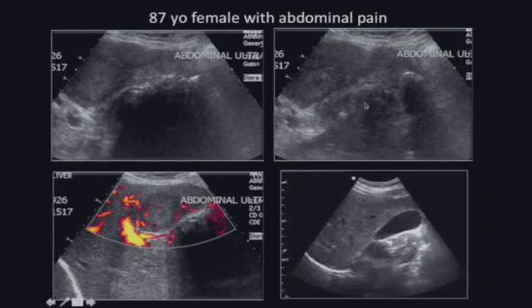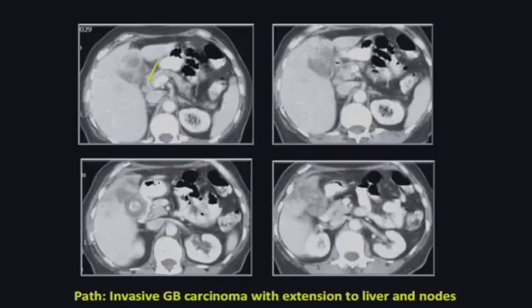This image alone should be highly suspicious for advanced stage of gallbladder cancer. Looking closely, there is no definition between the gallbladder margin and the hepatic parenchyma. Again, highly suspicious for direct liver invasion from gallbladder cancer. Then one looks for evidence of metastatic disease. The liver contains focal hepatic lesions. The combination of sonographic findings highly favor advanced stage gallbladder cancer.